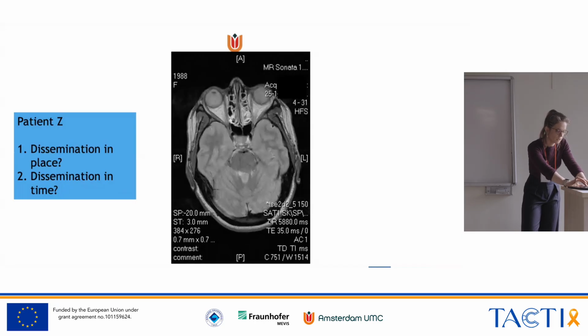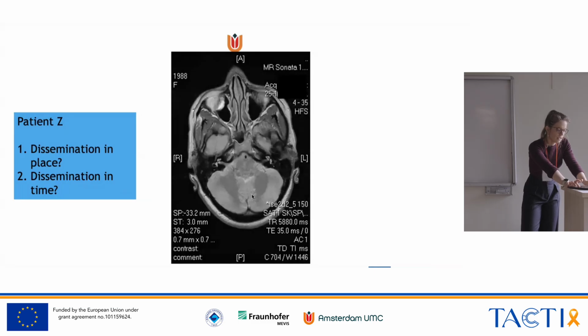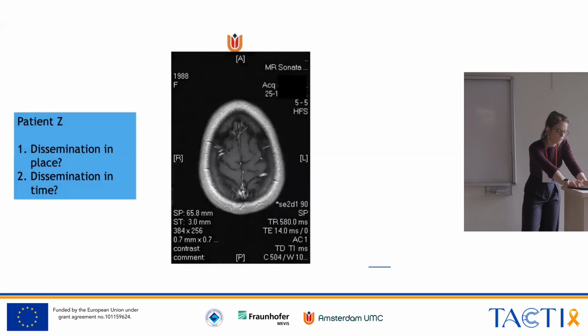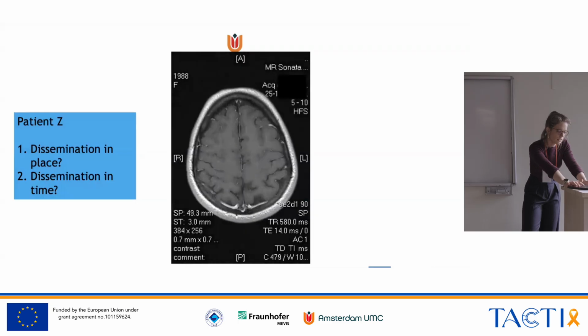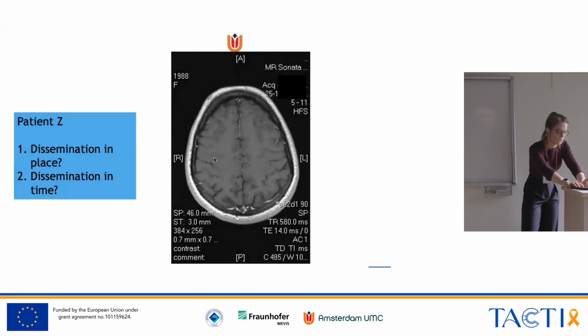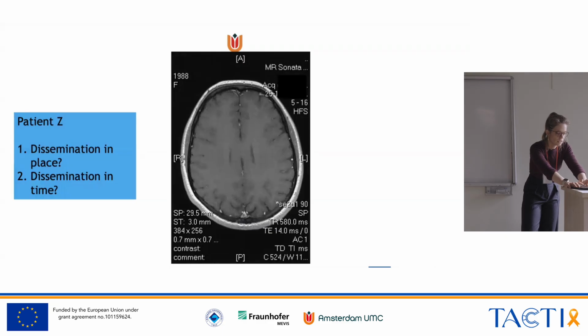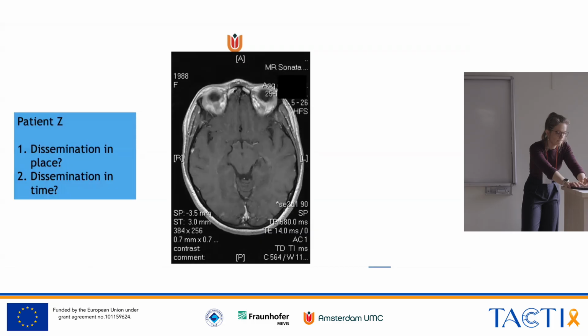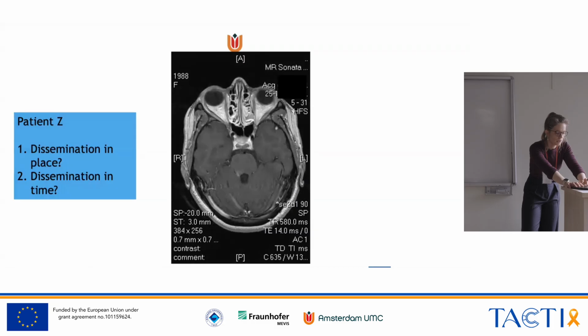Here, it's getting more clear. And if we have the contrast scan, you can see that the problems here don't enhance if you look through the images. But if you go down, you see a bit of enhancement here, I think. And more pronounced enhancement here.